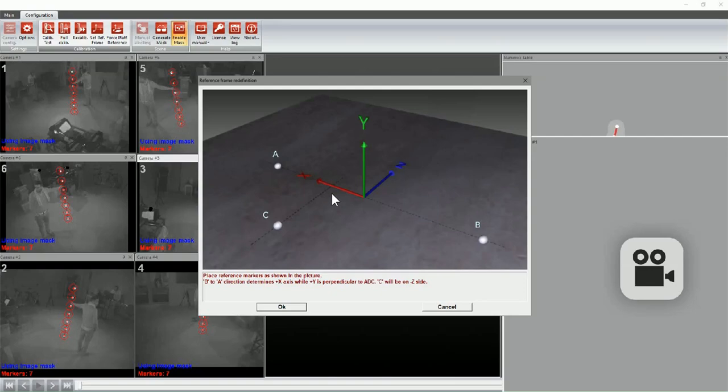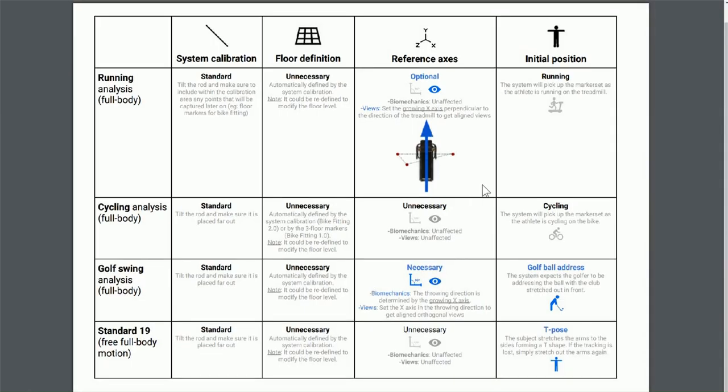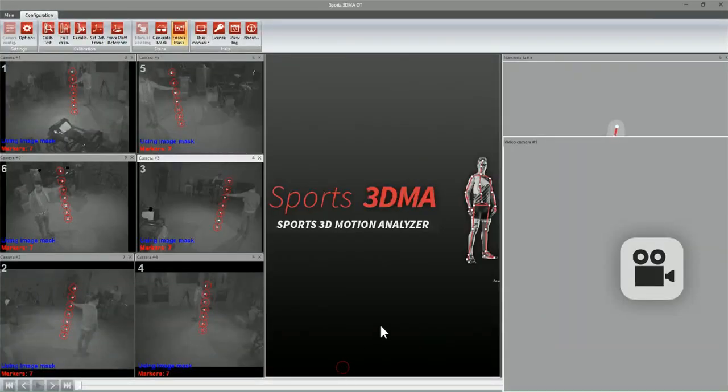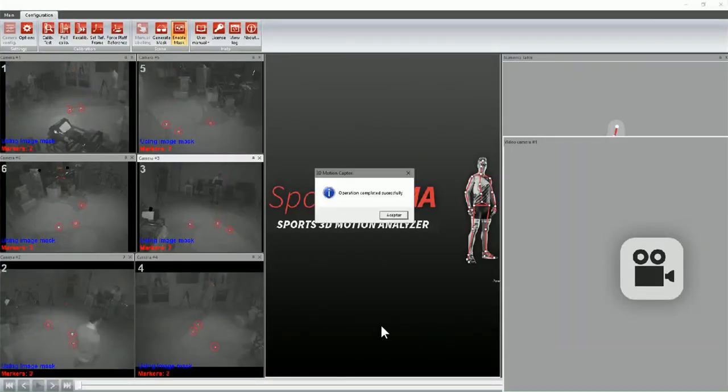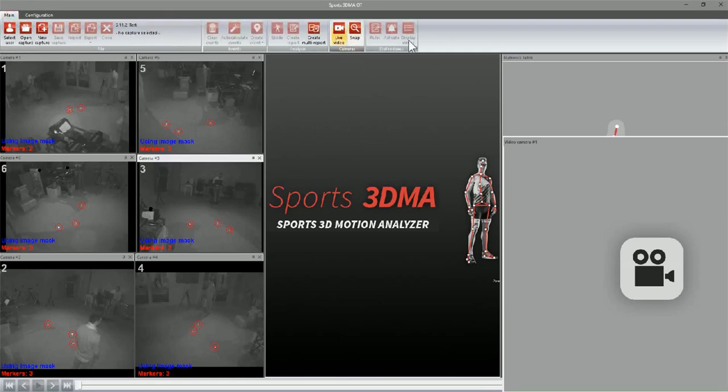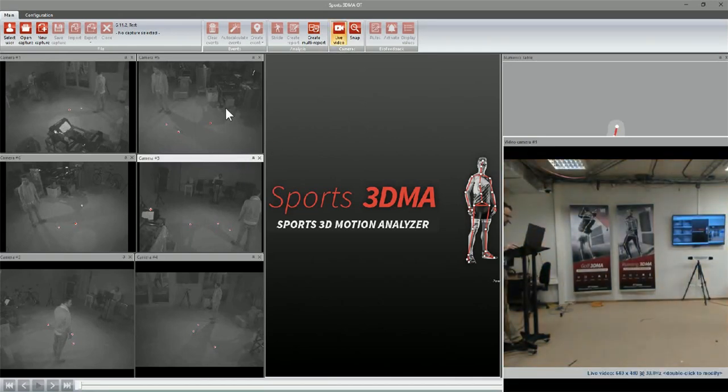This long segment is the one that is drawn like here. Okay, so my colleague places the markers, and I now hit OK, and the operation was completed successfully. Just to show you where I placed the markers, one second. These are the 3 markers. So we will be placing the treadmill in this direction.